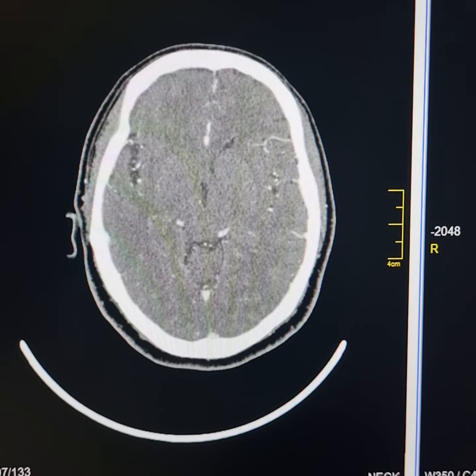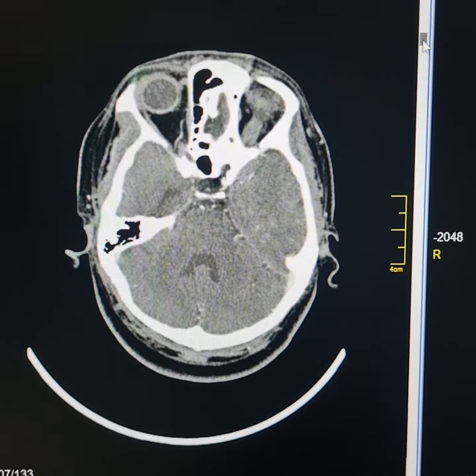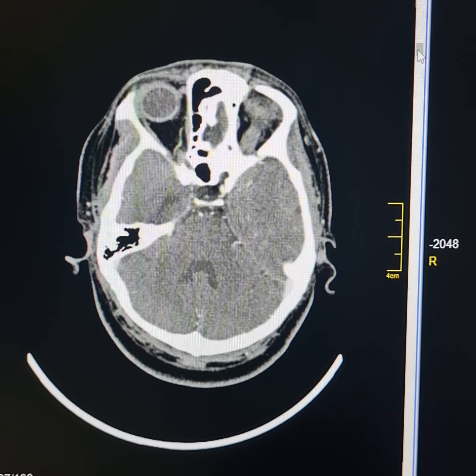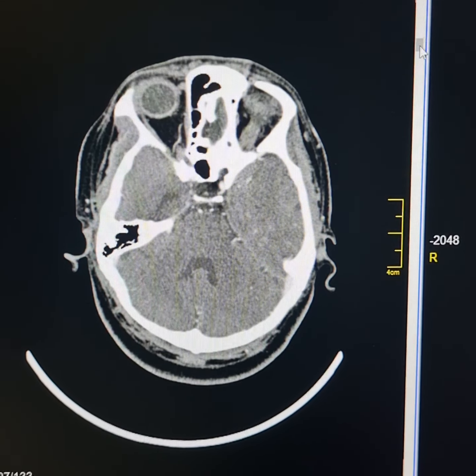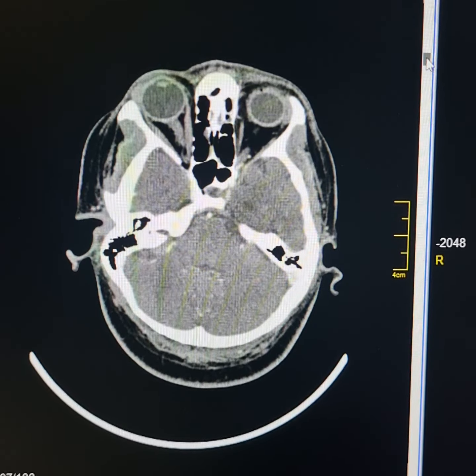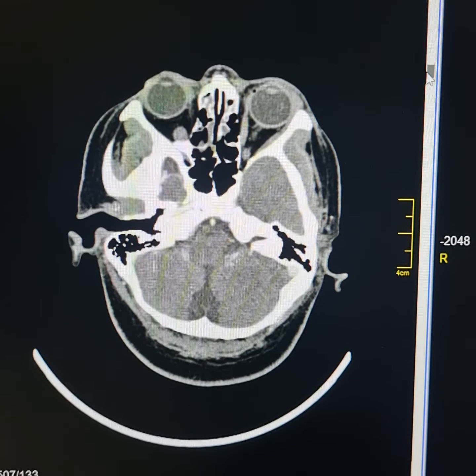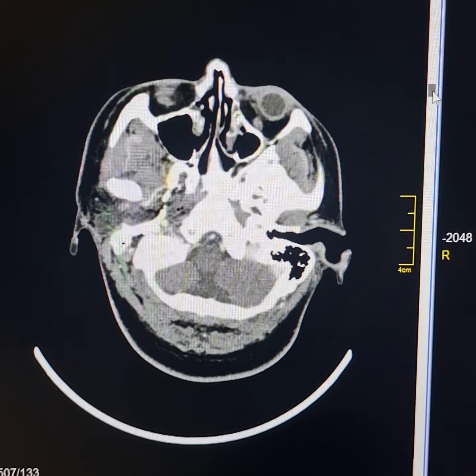This is a contrast CT scan of a 37-year-old female patient. She has had a cystic swelling along the right side of the neck for the last 12 years. It is painless, gradually enlarging, and fixed. Mucosal thickenings are noted in some of the paranasal sinuses, suggestive of sinusitis.